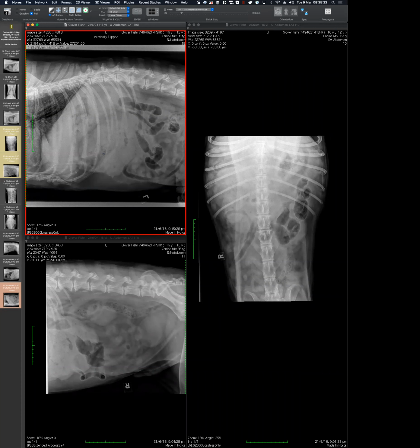I think it's probably spleen because we can see the liver, because of the gastric axis, we can think it's probably not the liver, and it's caudal to the stomach. Okay. Yep. Those were all good points. I will probably push back a bit on the idea. I like the idea that you are bringing necrosis into the game.